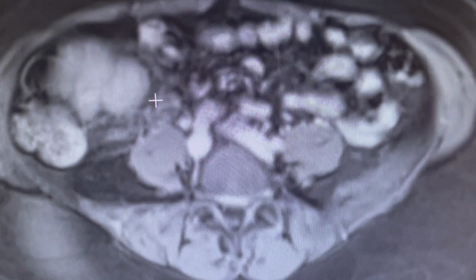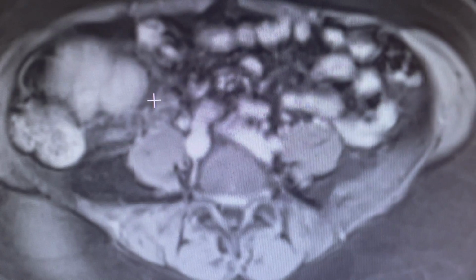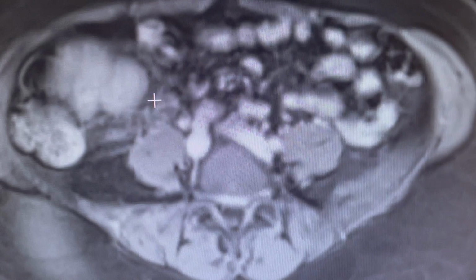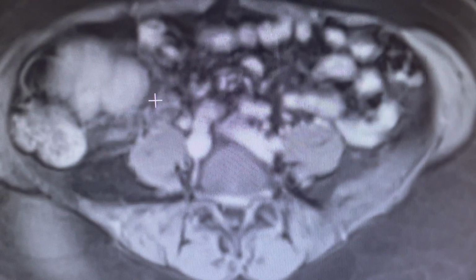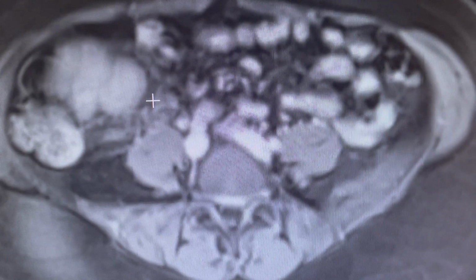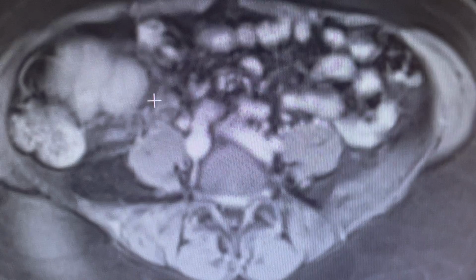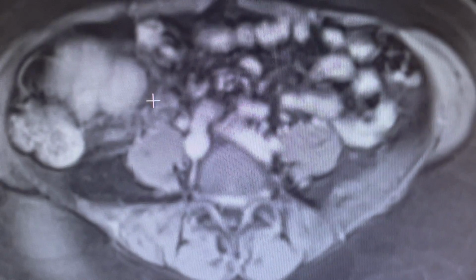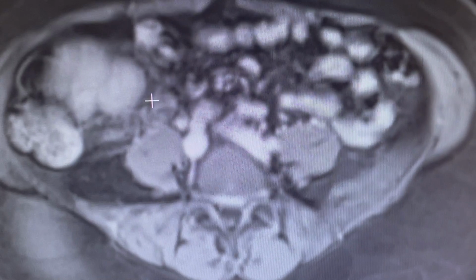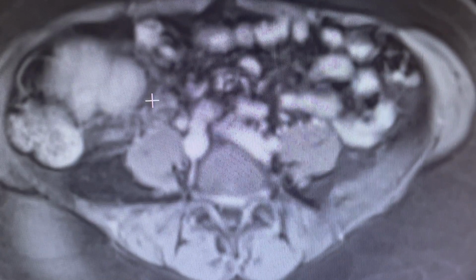Now, you could imagine, well, how about extremely rare metastases that have a high fibrous tissue content? Well, that's possible. But generally speaking, the vast majority of hypervascular metastases fade to background or show some washout. These retain contrast. The small lesions, however, all faded to background.